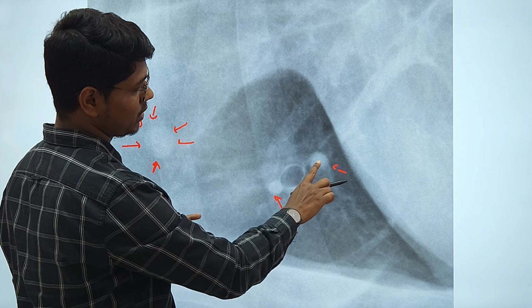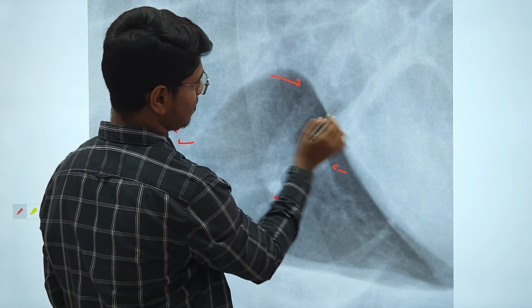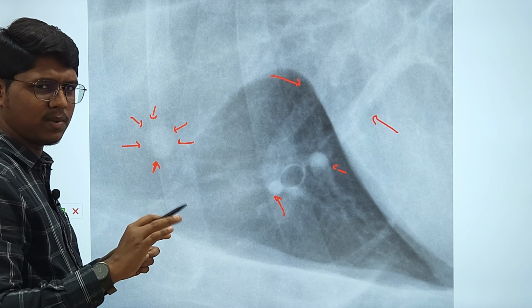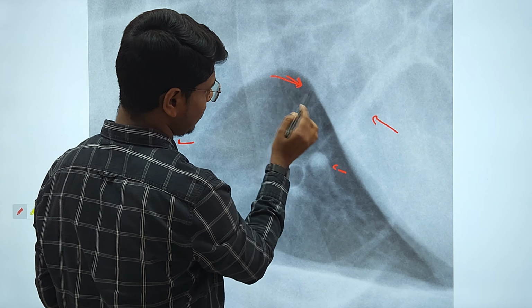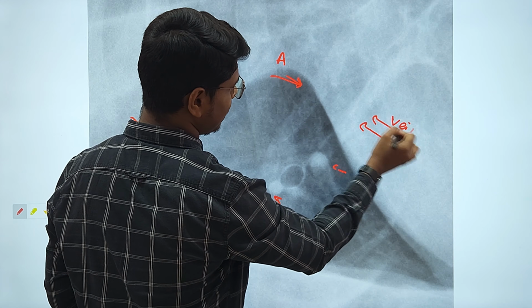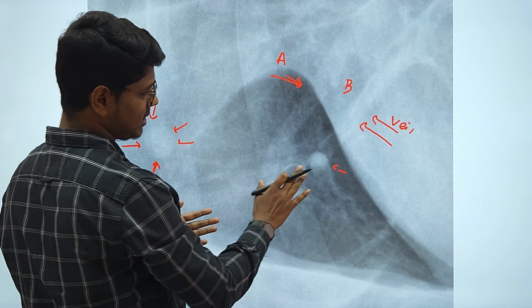This is actually not a nodule. These are basically the pulmonary vessels. Can you see two vessels here? I told you about the cranial pulmonary vessels in the cardiovascular system, also in normal radiographic interpretation of thorax. The anterior or cranial one is the artery, then the caudal one is the vein, and in between is the bronchus. But in this particular radiograph, you can see the three structures.